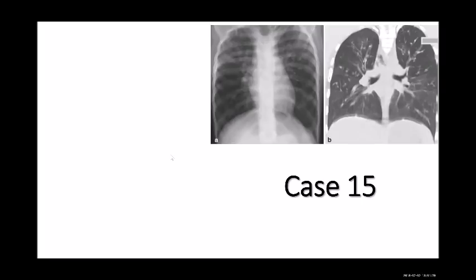Vascular markings. Dilatation? You can see this is an airway, right? This is an airway, right? You see here is an airway. And also you can see this. See, this looks like this, right? So what is it? Bronchial dilatation. Bronchogram. Dilated bronchioles. This is dilated bronchioles or dilated airways. I don't know whether it's bronchioles or not.